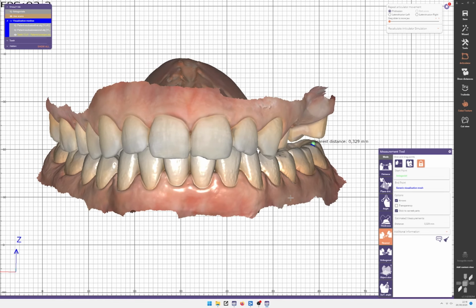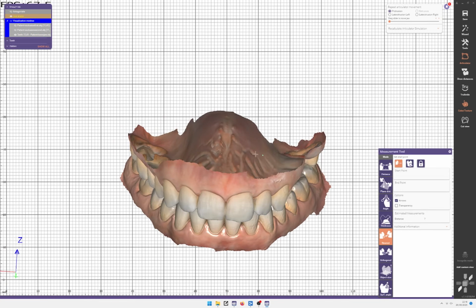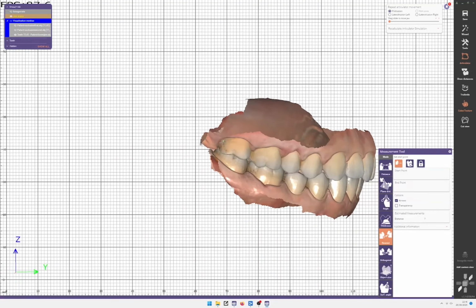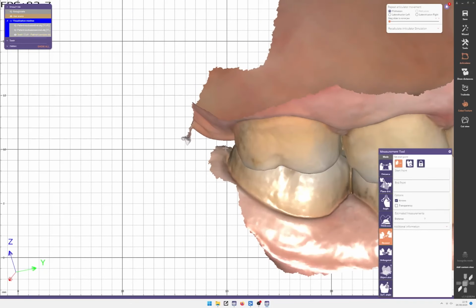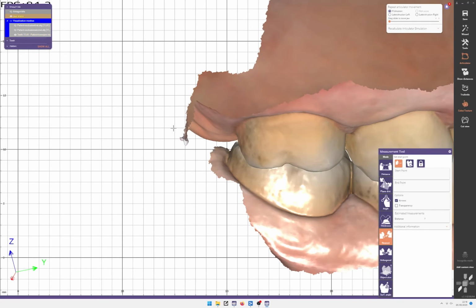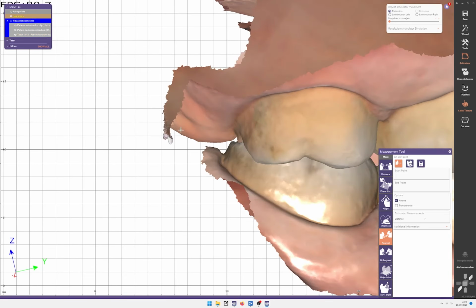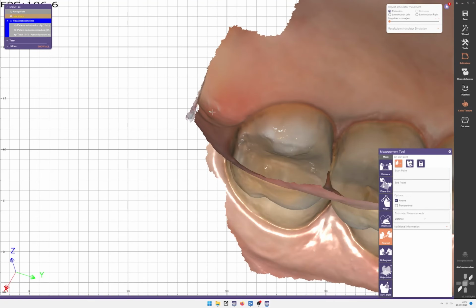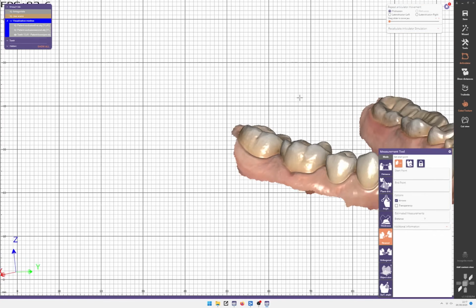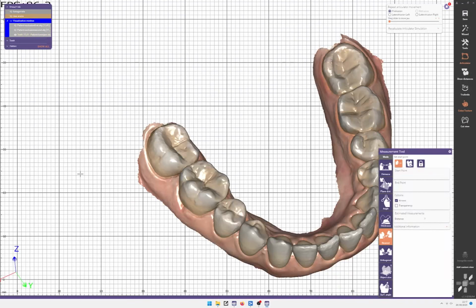And another thing for the end that I could mention is sometimes you get meshes that, due to the high tuberosity here, may intersect at the back. The gum of the upper or the lower, doesn't matter, may intersect a tooth or the gum in the opposing arch. So what I first do, I didn't do it here because I know this case, and I know you didn't have this, but whenever I load, I always first edit the mesh.